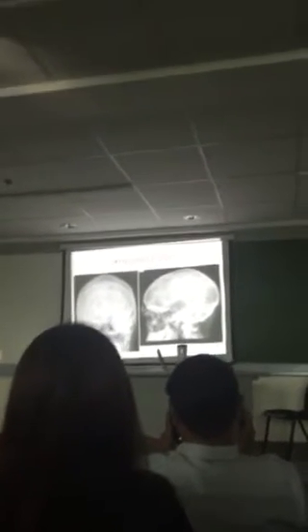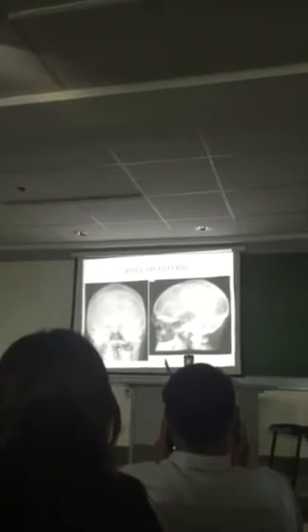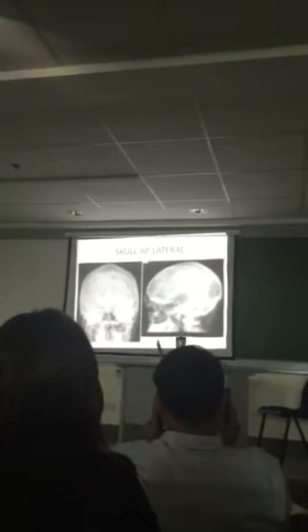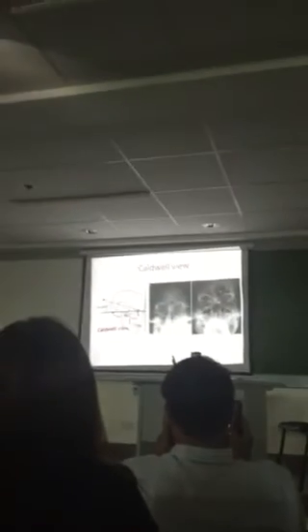Lambdoid. And the one here? Lambda. And this one? Sagittal, coronal. What is this here? Bregma. Okay. So this is Caldwell.